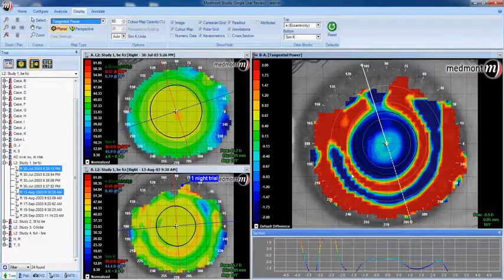The red ring is where your reservoir of tear is on your orthokeratology lens, creating the greatest suction force. That effectively steepens the cornea up. If this red ring runs parallel to our pupil margin, then we know our orthokeratology lens was well centered while the patient was sleeping in the closed eye environment.